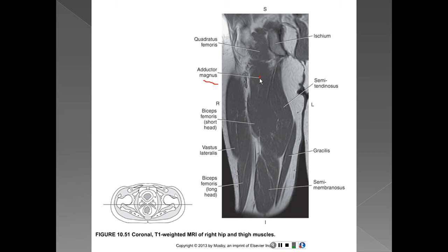It lies medial to the psoas major muscle in the superior thigh, then narrows as it courses inferiorly to insert on the medial lip of the linea aspera at the pectineal line, distal to the lesser trochanter of the femur. So the pectineus muscle has an insertion point on the pubic bone, and the other insertion point is distal to the lesser trochanter of the femur.